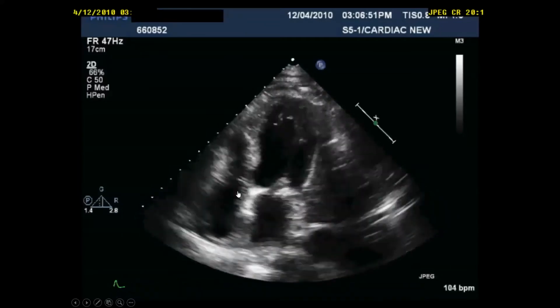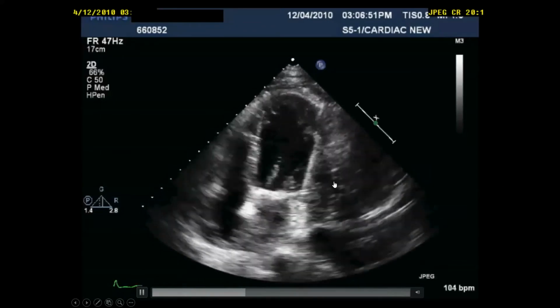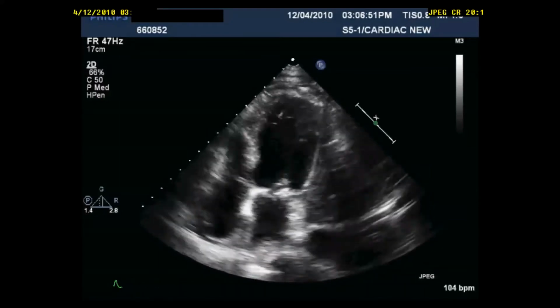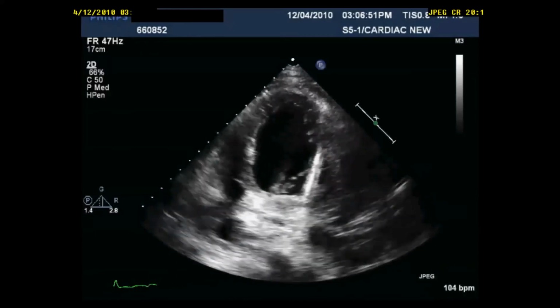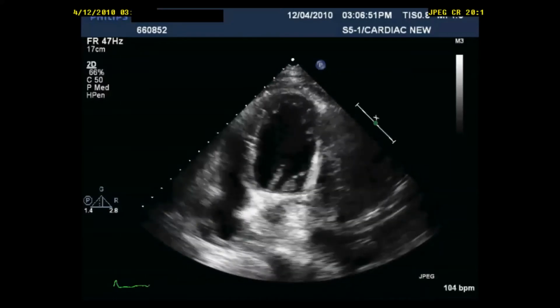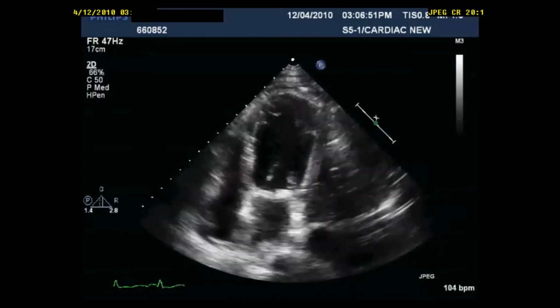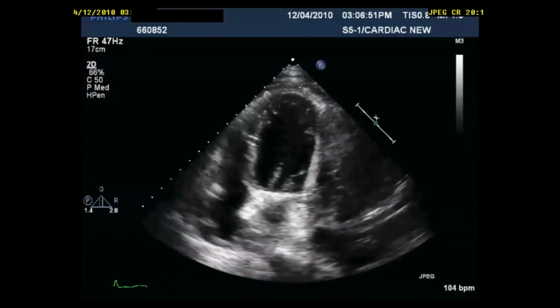Now, this is apical 4. Usually in the exam we try to select the best views, but sometimes we select some challenging views like this just to add a flavor of difficulty. But usually the examiners are more into easier, obvious, clean, crispy views rather than this one.